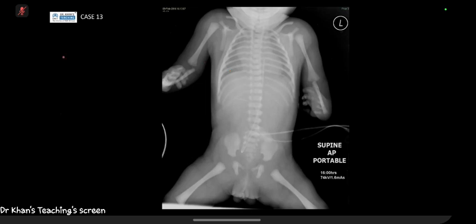Is this an infant babygram of an immature infant? I didn't see an ossification center, ossification of the upper limb. I see there are two lines, an umbilical arterial catheter, which is going through the chest. I think it is in the proper position, the upper end.